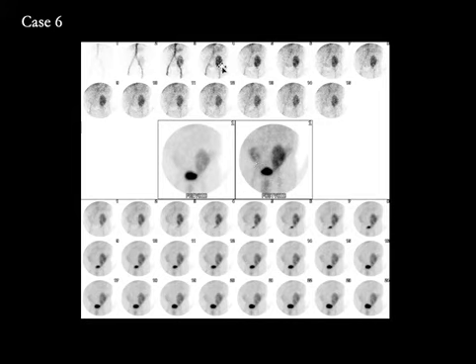So the findings of good blood flow and compromised function are consistent with either acute tubular necrosis or cyclosporin toxicity. The way to differentiate between the two is when was the transplant performed. ATN is more acute and it happens after transplant. Cyclosporin toxicity is more chronic when the patients have been on cyclosporin for some time, and the imaging appearance is the same: good blood flow and compromised function.